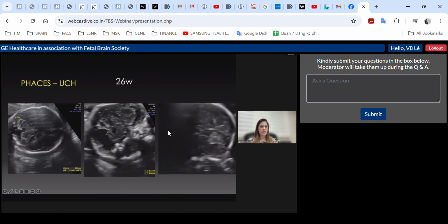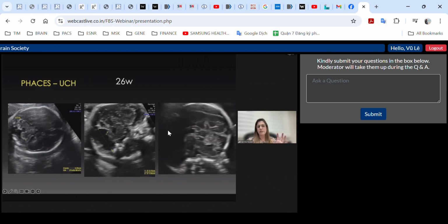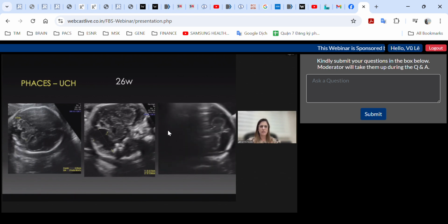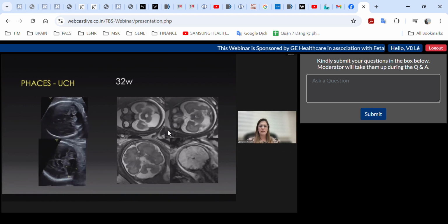with the same shape, the differential diagnosis also with a big arachnoid cyst that displaces the cerebellum, but most cases are sent because someone thought that there is a Dandy-Walker malformation. And here the MRI will not show signs of hemorrhage affecting this hemisphere. And this is one of the important insights.